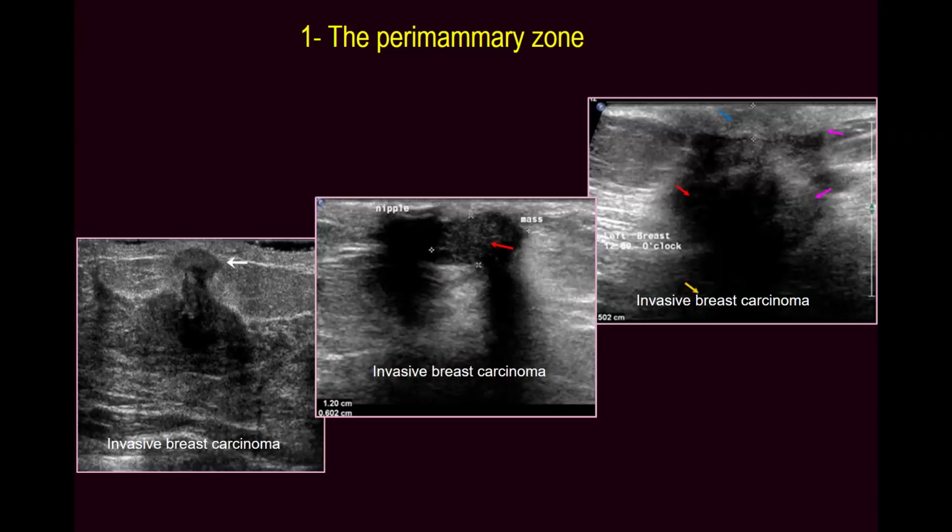How are you going to evaluate this lesion, or what do you suggest? Why are these lesions seen in the pre-mammary zone? In this case, the epicenter of the lesion is obviously within the mammary zone and extends into the pre-mammary zone and infiltrates the skin.